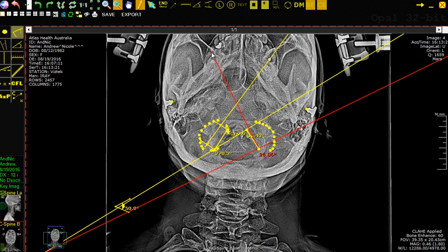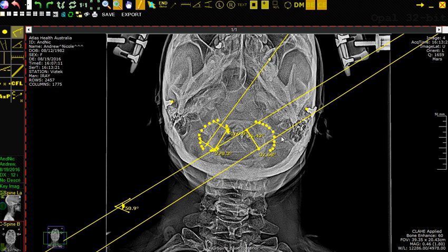So you'll see in a moment that that would actually make it much, much worse. And so instead of doing it this way, I'm going to do it this way. So right there. If there was a way where we can create a 90 degree angle from this point to this point and then simply push a click on the outside part, that would be great. But better yet if it could pre-calculate everything, because now what we need to do is again do the intersection between these 2 points.